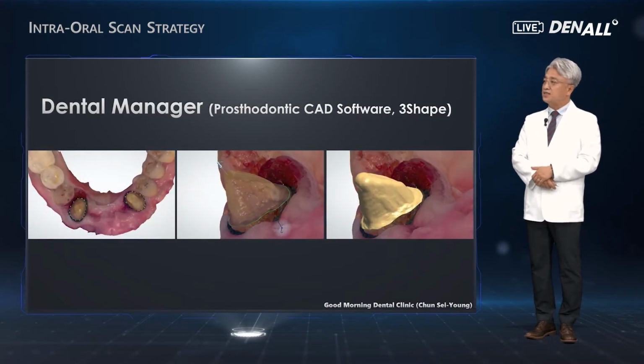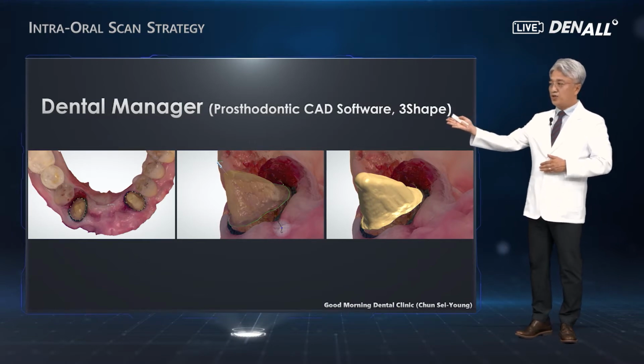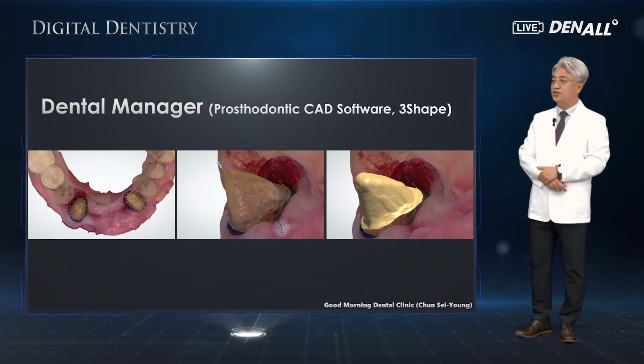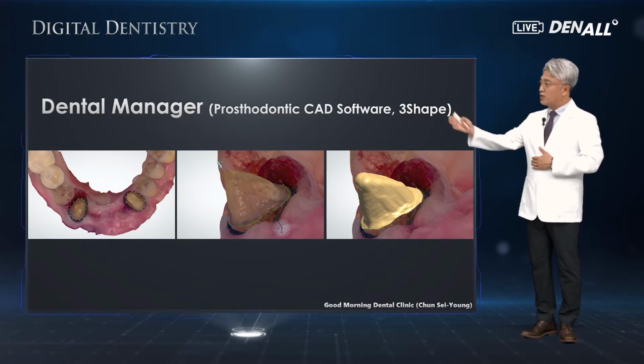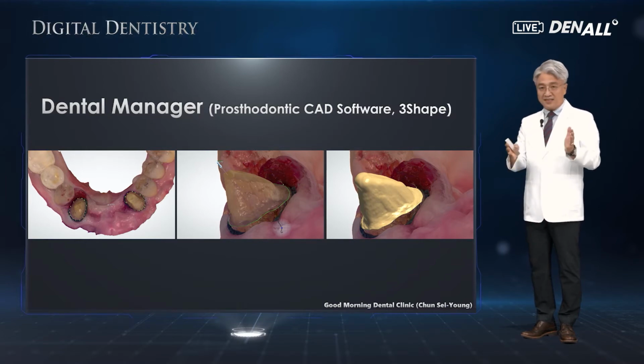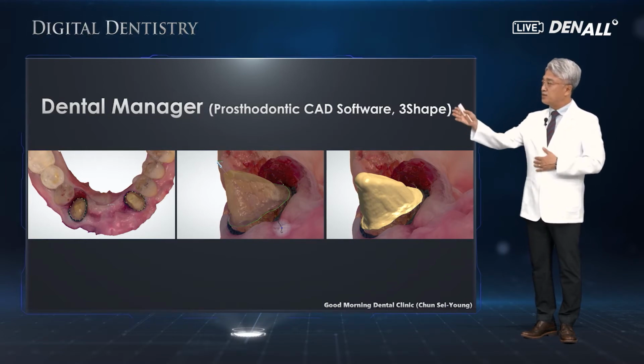This is the prosthesis CAD designing process. The first one shows the borders to make the model's die space. The middle one is the amplified picture. Accurate margin lines can be found to make clear the margin fit of the prosthesis.